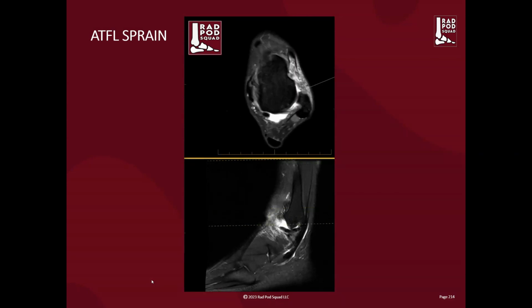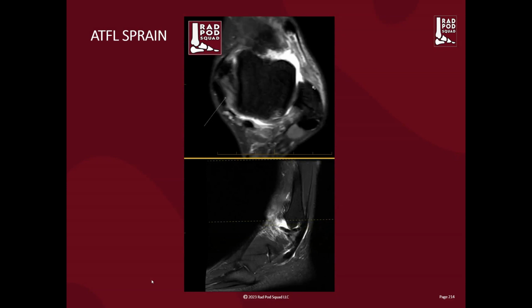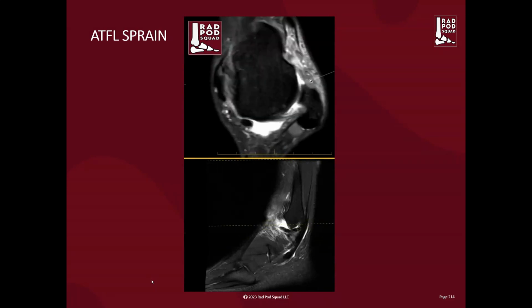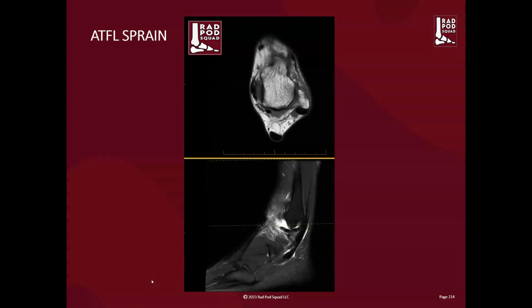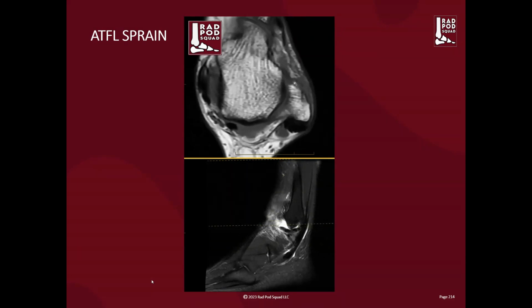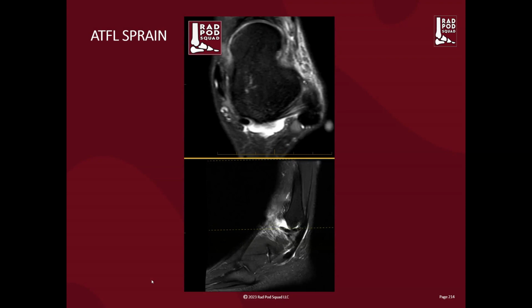Moving past that region, now we get to the region of the anterior talofibular ligament, and notice I have an irregular ligament, the fibular attachment also slightly more frayed, and when we look at this under also T1, we can see the sort of irregular changes along the bone, the early pull along the bone, the stress-related change. So just bring it back up to our axial images. We can see that I would call this a sprain/partial tear because it has laxity to it. That's the rest of the ATFL.